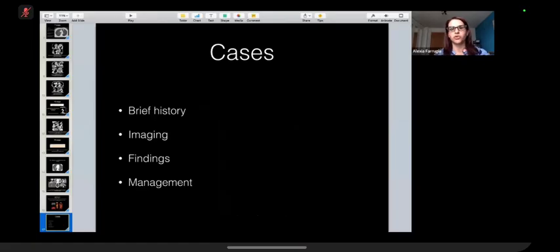So now we're going to move on to some cases. I will give you a brief history, which is the scenario you would have in the 2B Viva examination. Sometimes it is relevant, other times it is not of much help. But then I will show you the imaging, and I will scroll for you for each candidate. And then we will go through the findings and discuss the management.